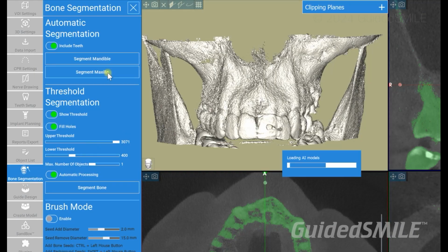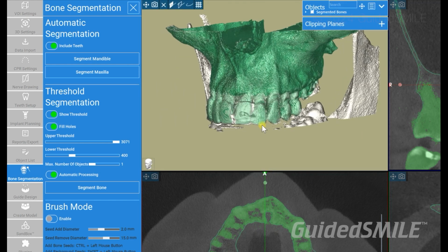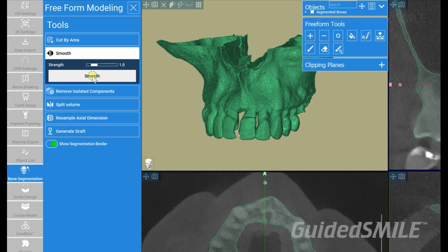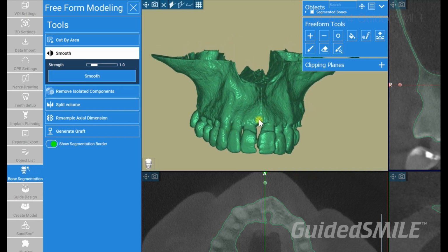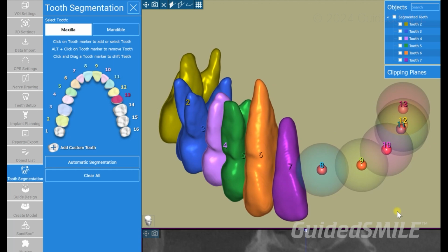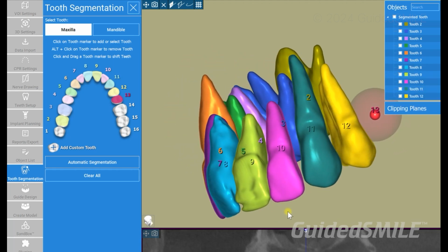You'll notice in the same tool pop-up that you can also do a root segmentation and a crown segmentation. What does that mean? That means it's going to take all the teeth in the arch, upper, lower, and it does it upper, lower separately, depending on which one you need. And it will pull out the clinical crown and the root as a separate file, right? And that way you can plan your cases better.